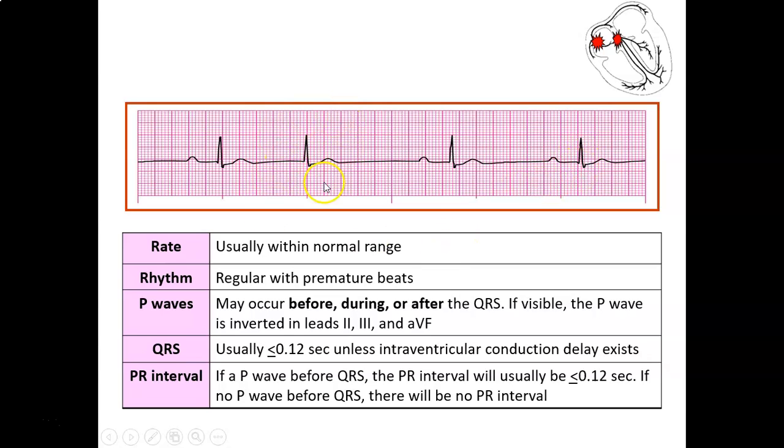So it means complex number 2 is different than the rest of the three complexes. QRS duration is narrow, so it means all are coming from above the ventricles. And PR interval is increased, long, in complex number 1, 3 and 4, and we'll talk later about the importance of PR interval in blocks. But here just focus on this.